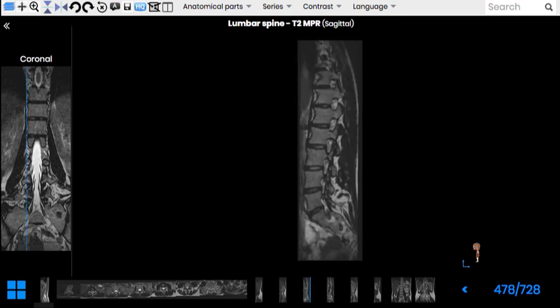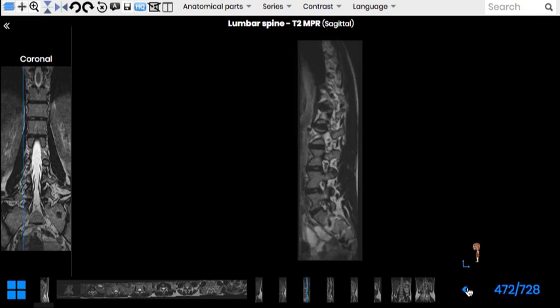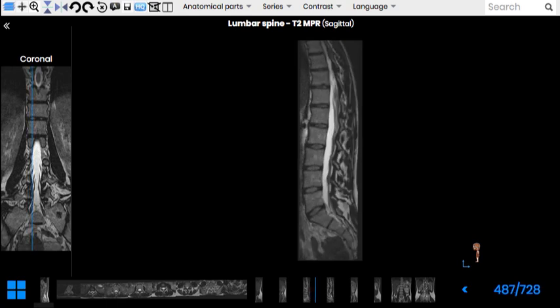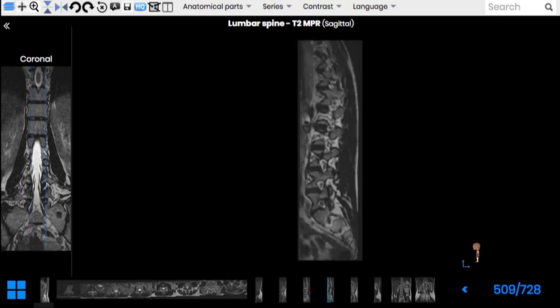Especially the L5 intervertebral foramen is vulnerable to injury. You can see it is a little bit narrower from the beginning, and the vertebral bodies change the angle here. So the L5 intervertebral disc is the one most commonly suffering the largest pressure and is commonly herniated. So this intervertebral space and IV disc, the L5, are vulnerable to damage.